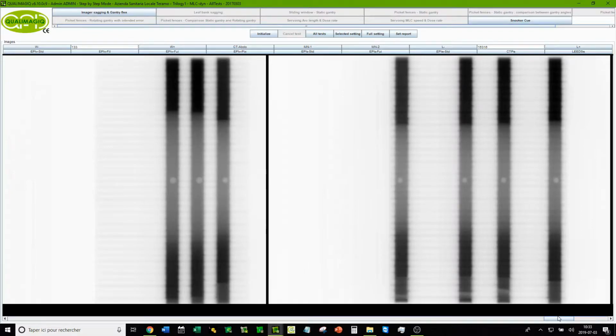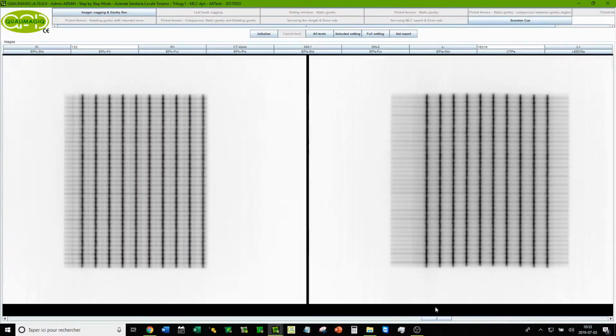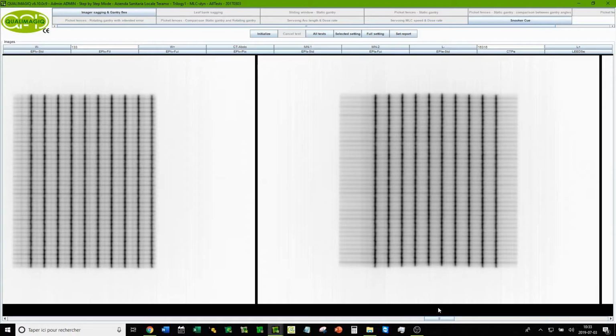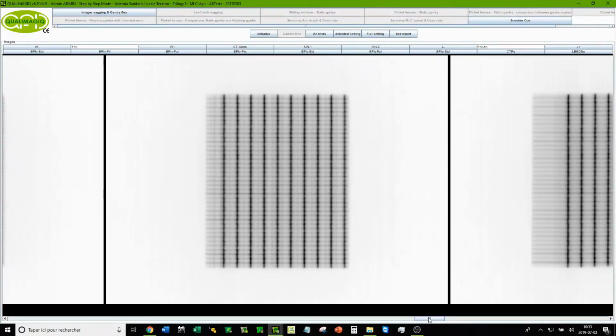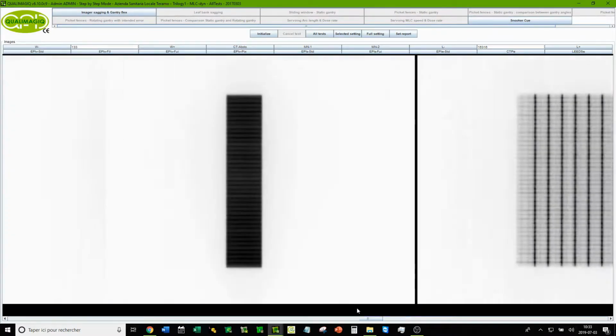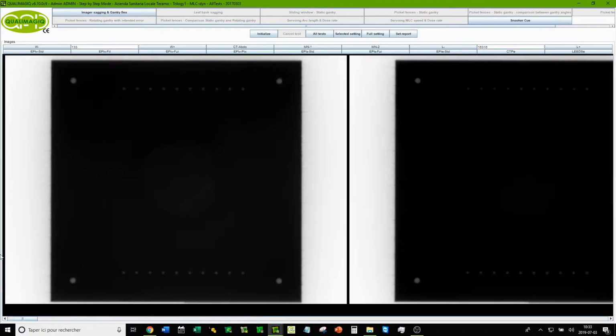As you recall, there is a fundamental problem to correct: portal imager sagging, impacting the right-left positions of the slits. There is also gantry flex, which impacts the images head-foot longitudinally. It's crucial to deduct the impact of the imager and the gantry faults from the measurements of the MLC performance, because the amplitude of these 2 improper movements is more than 5 times the tolerance of the leaf position test. We have a pretest for this purpose.